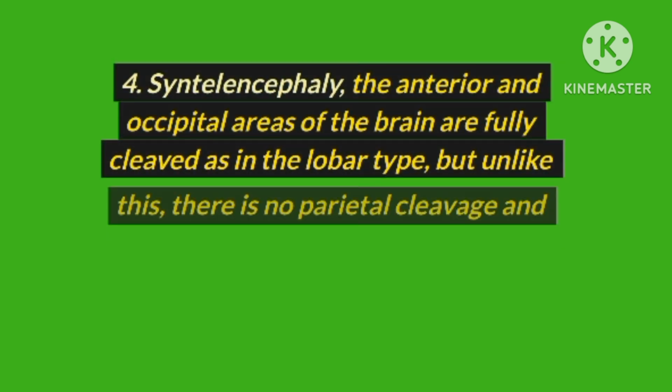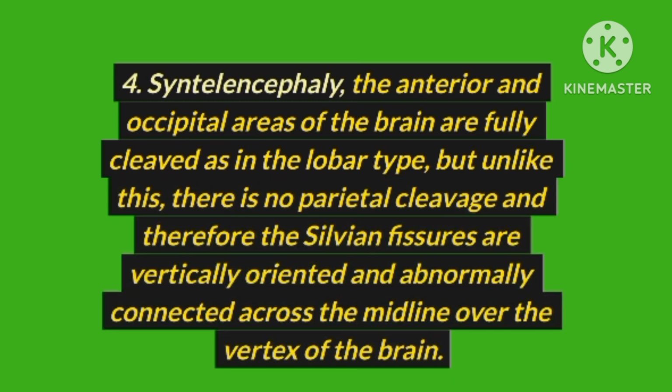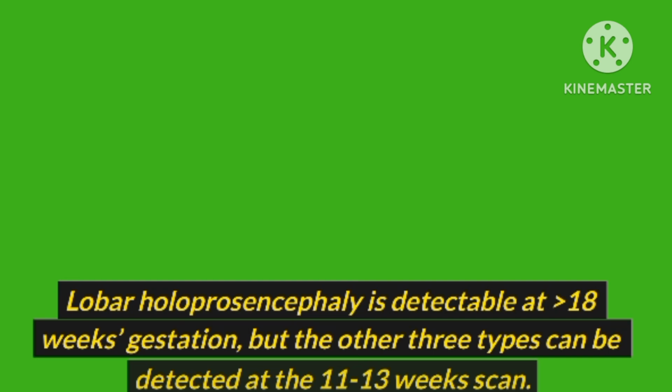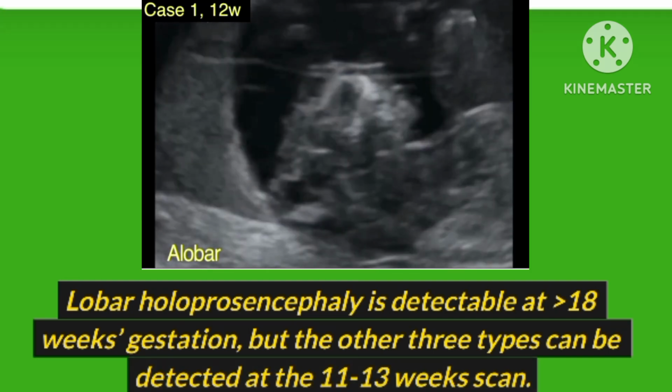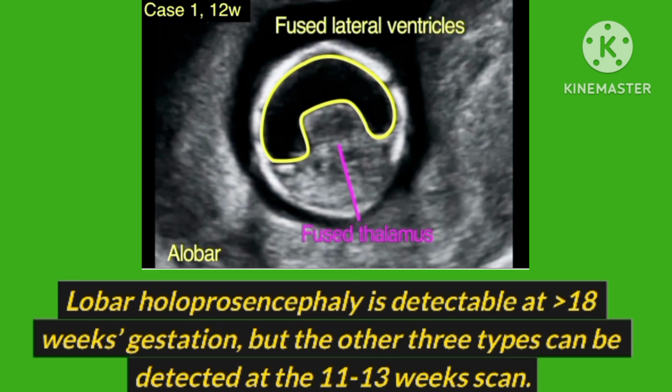Syntelencephaly type. The anterior and occipital areas of the brain are fully cleaved as in the lobar type, but unlike this, there is no parietal cleavage, and therefore the sylvian fissures are vertically oriented and abnormally connected across the midline over the vertex of the brain. Lobar holoprosencephaly is detectable at greater than 18 weeks gestation, but the other 3 types can be detected at the 11 to 13 weeks scan.